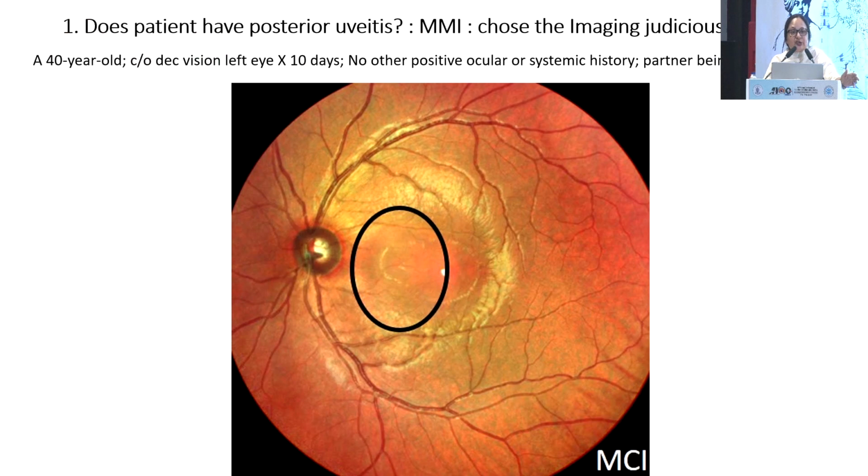Now, choosing the right imaging modality is very important. We generally look at our retina colleagues, and whatever our retina people tell us, we start following it blindly without even understanding whether that will be applicable in the context of uveitis or not. Now, here is a picture. Multimodal imaging, we do have pseudocolor. Now, Heidelberg doesn't even have the true colors.